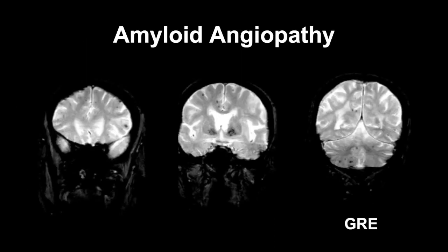And I just wanted to show you that sometimes you can capture those patients before they develop an intraparenchymal hemorrhage, and you're just going to see those microhemorrhages. Again, we have seen those microhemorrhages for trauma. Actually, microhemorrhages can also happen in patients who have chronic arterial hypertension, and they can happen also in patients with amyloid angiopathy.